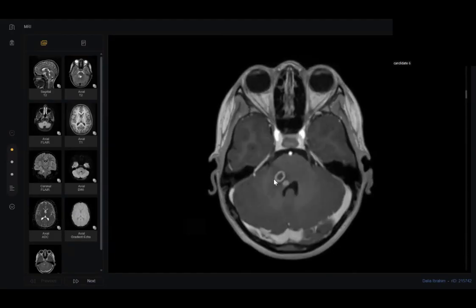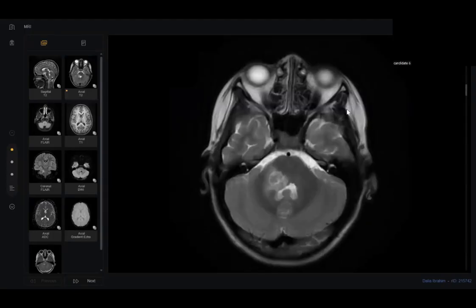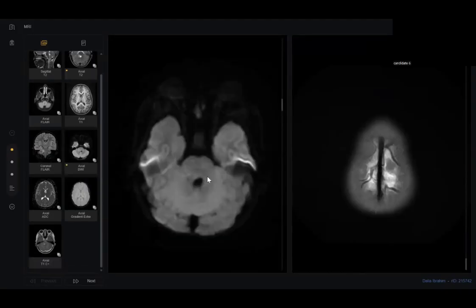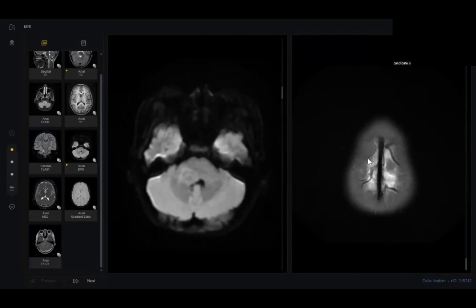A peripherally enhancing lesion, and the wall is uniform, looks like an abscess, but without the high T2 in the center. This is the point. Without high T2. Why does tuberculoma have low T2? Why is the center non-restricted? Sir, there is a pathological cause.